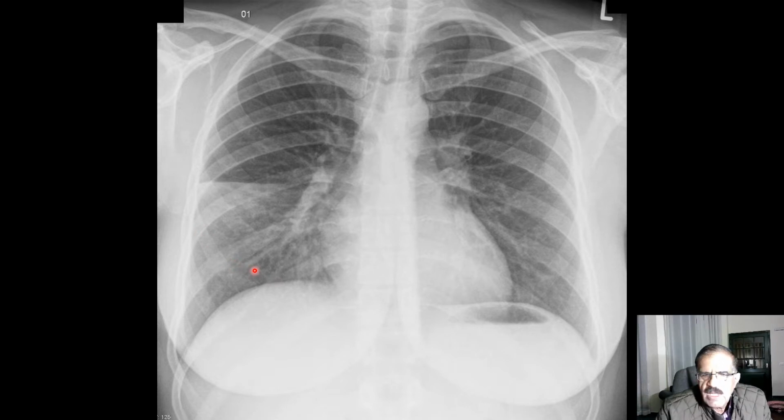Of course, after diagnosis, treatment is offered, and this patient might not develop full consolidation of the lobe. But if it is not treated, then it will progress to involve the whole right middle lobe. So this is simple right middle lobe pneumonia which is developing.